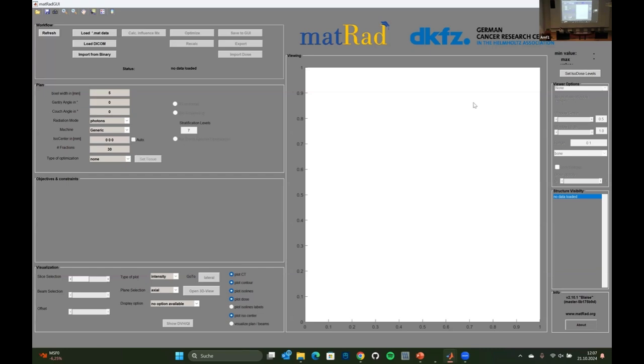Good. Here we will later see the patient and we'll have some other visualization things. So there's a lot of stuff grayed out. In the particle therapy masterclass, we sometimes use an educational version because we have school children, and then we gray out some other areas as well. So depending on which standalone you have, there might be even more stuff grayed out, but that's fully okay. All the workflows we can do should be feasible.